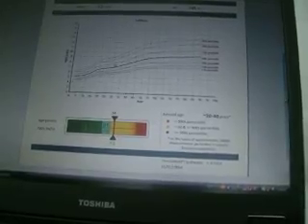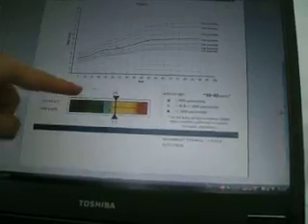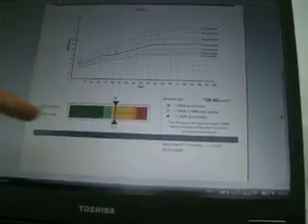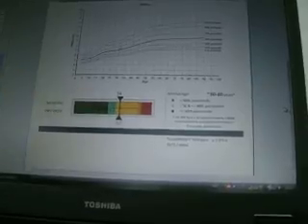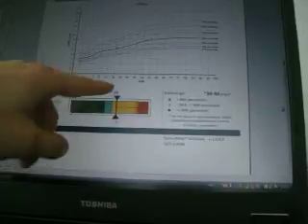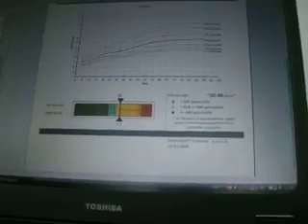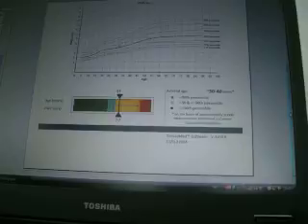If there is a great difference between the two, that gives you some warning about the status of the patient. Okay, we always prefer these values to be in the green field, meaning that the arteries for the patient should be always as young or even younger than the calendar age of that patient. In the yellow line, that's just a warning, but if they are in the red field, then you can be quite sure that the patient is in a high cardiovascular risk.